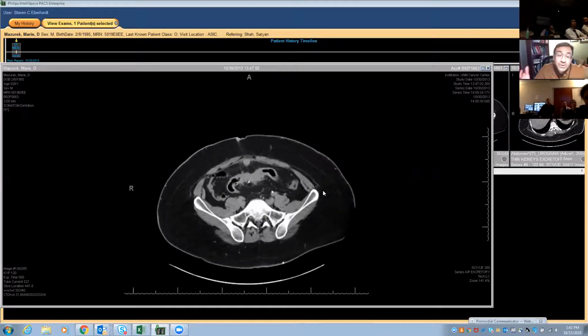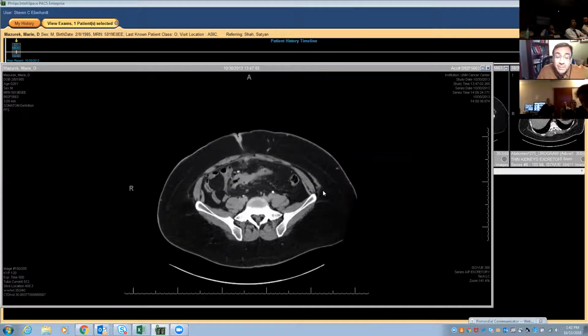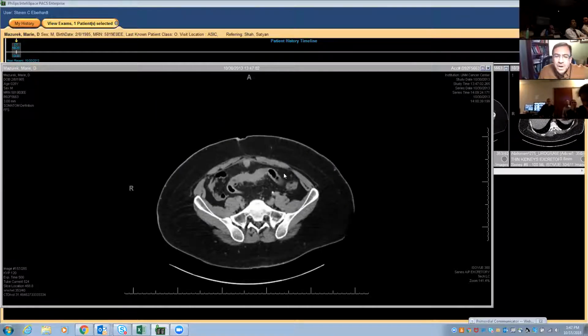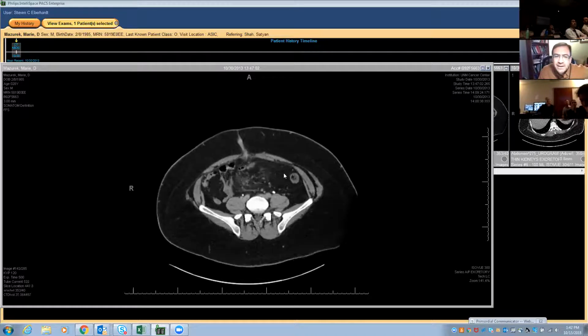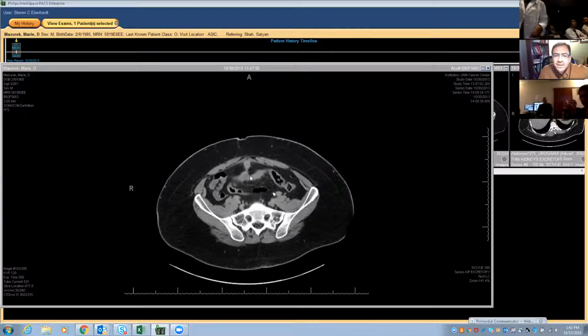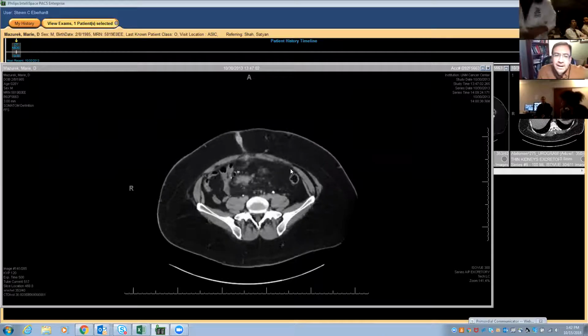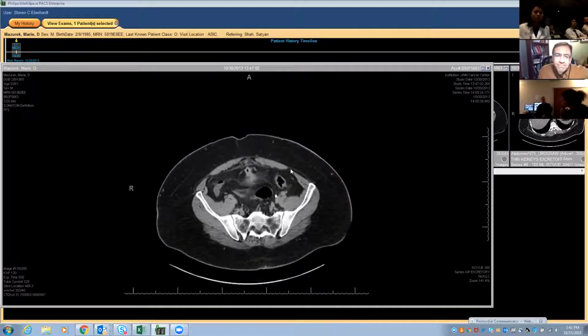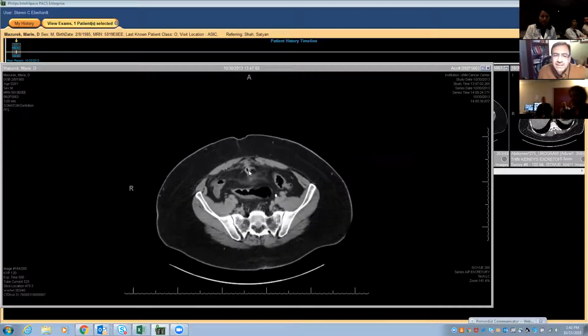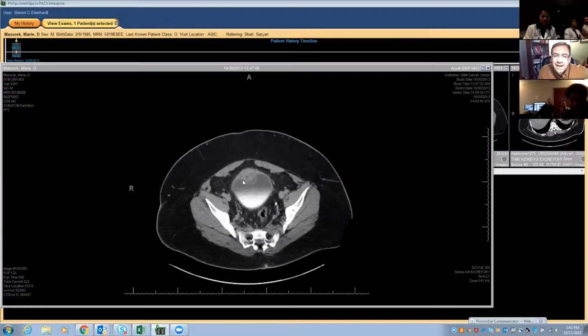The urachus, as you know, is the obliterated, or urachal remnants are basically, when it obliterates, it forms the median umbilical ligament. It's hard to know if that was the median umbilical ligament or there was some patent space in there that the diverticular disease fistulized to. Even as a median umbilical ligament, it could have a potential space down the center of it that could be filling with the inflammatory exudate from the diverticulitis. In any case, it leads down to the bladder wall.